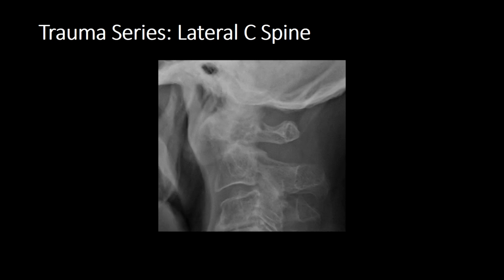Here's another cervical spine centered on C1, C2. I'm going to let you work on this by yourself. I want you to draw in the width of the vertebral body of C2. I want you to find the anterior tubercle of C1, and from that calculate the width of the peg. Then we'll look at this together on the next slide.